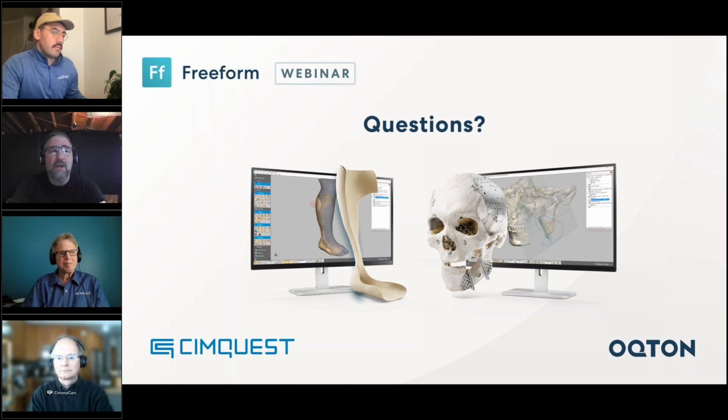But there's not a lot of tools specifically around things like measurement or anything that I think might be better suited for quality. But we can export the data and then import it into D2P, for example, and then you can do the analysis in your original segmentation software. Right. But if you're just looking for a visual, how does this device line up over the top of a bone profile, then yeah, we can certainly do that in Freeform today.